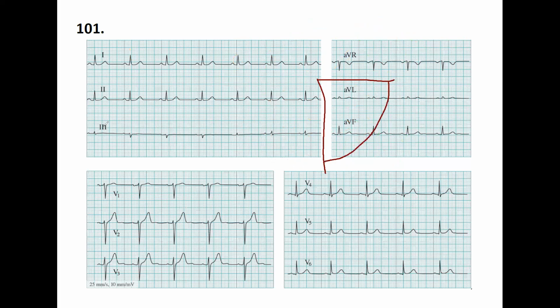Let's look at lead number 3. Lead number 3, that's very good because it's perpendicular to 30 and exactly meaning that it's a very small, okay? It's meaning that exactly perpendicular. So that axis is around 30.